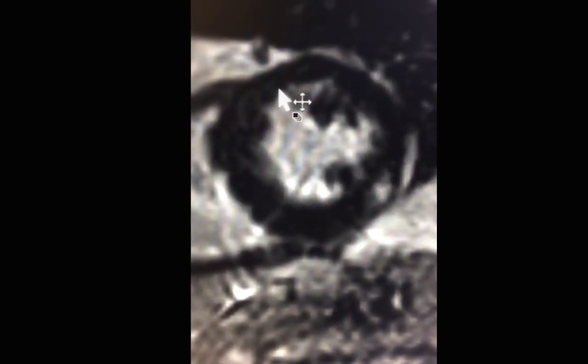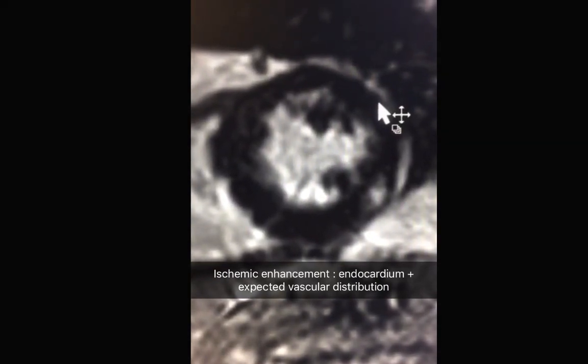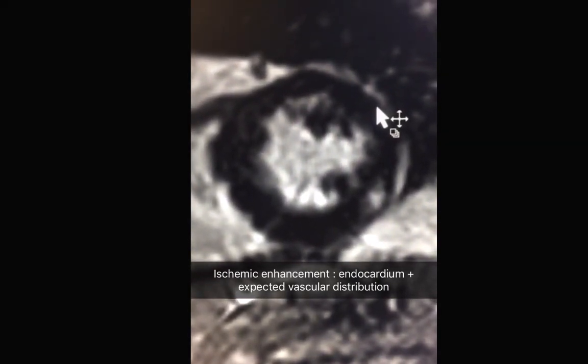From all of that, we know that if you have an ischemic type of enhancement, such as enhancement from a myocardial infarction, such an enhancement would stick to certain rules. First, the endocardium should be involved. Second, it should be in a vascular distribution. So with ischemic enhancement, you should have involvement of the endocardium and a vascular territory.